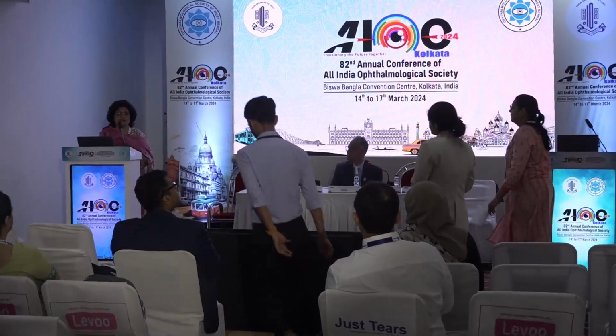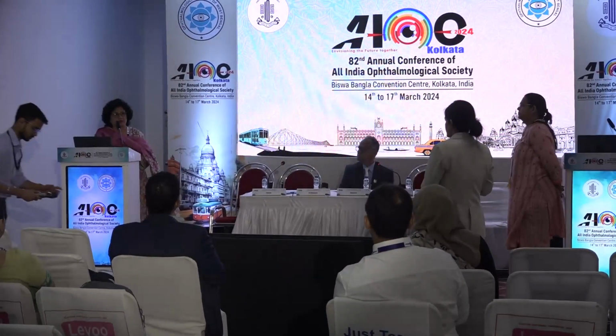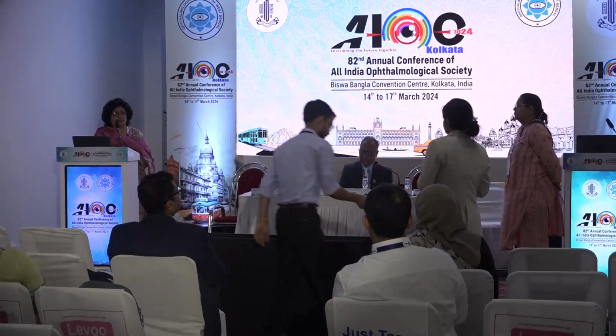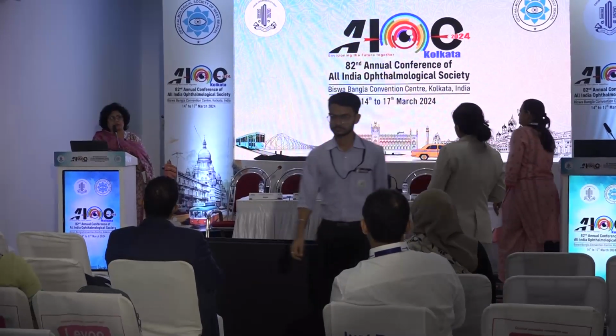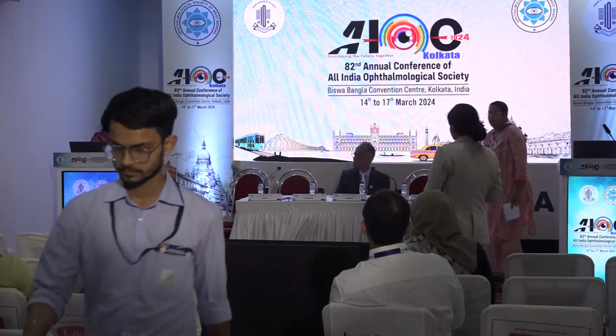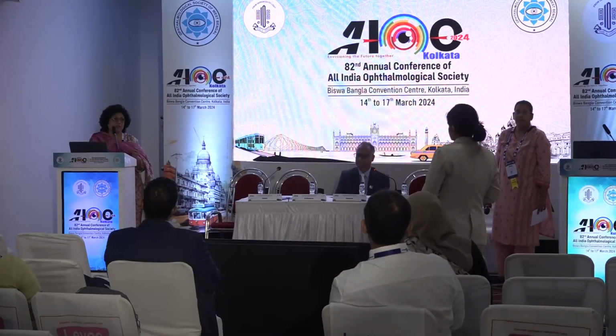How frequently do you do FFA? Do you pick up all the babies or just selective babies? Not all the babies. Initially, we started doing it as a project on all the babies who get ROP, because we had to tell what the predictors of development of type 1 ROP are, since all the babies who get ROP don't land up in treatment. That is the time we started doing it, but now we do it in select few.